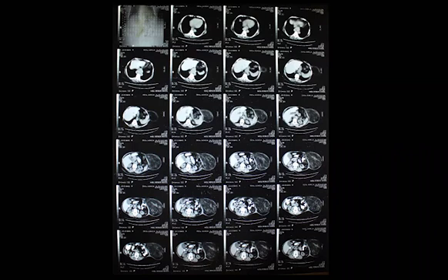Yallah, this will be our very last image for this morning. Mona has done a great job. We've reviewed a few para-aortic lymph nodes and a few hernias. I think our pace is a bit slower than expected, but it's no problem. We did not get CTs done on the days during our live meetings, but I don't think we've got any problems whatsoever. Alhamdulillah.